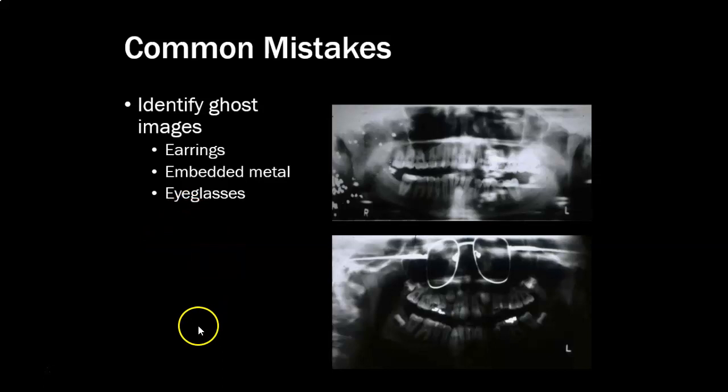Identify ghost images. So we see all kinds of ghost images. So look at all of this stuff here. This is the ghost image here. It's the opposite side. It's blurry. It's larger. I'm not sure what those are. It's a whole bunch of something.